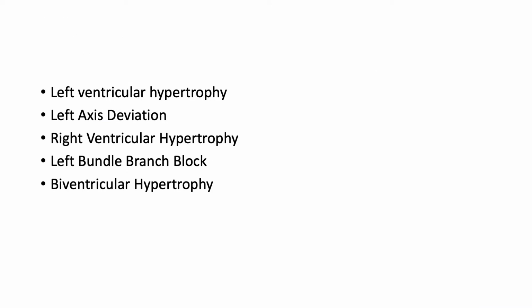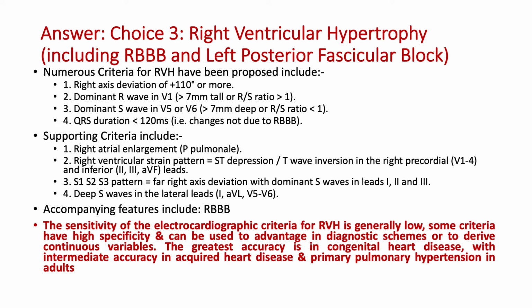These are the choices. And the answer is choice 3, right ventricular hypertrophy.